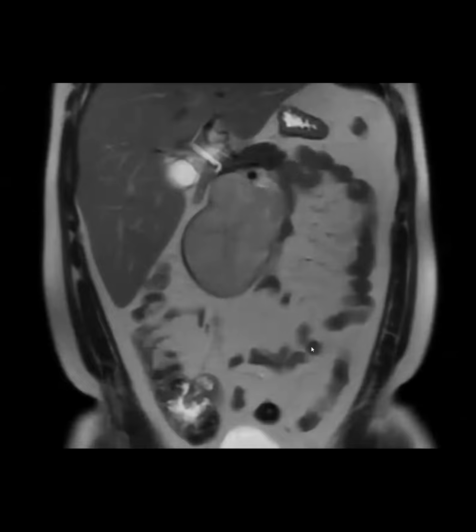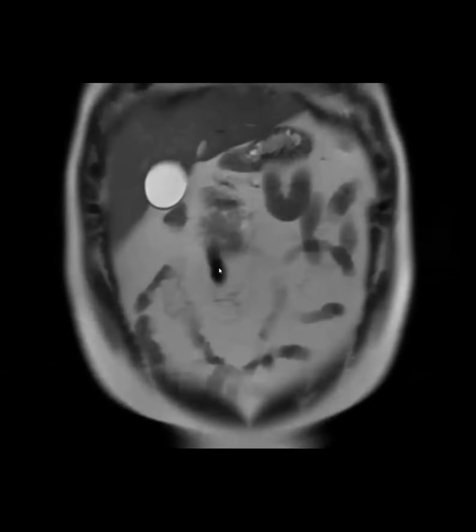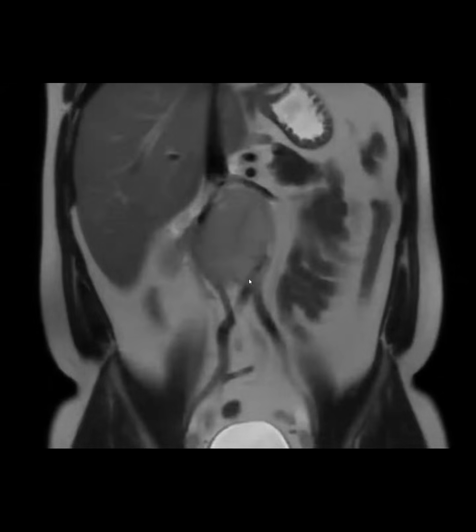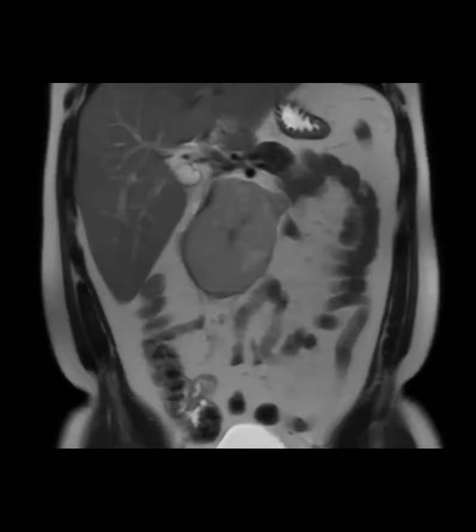Sorry, let me get these measurements off. Pancreas. Okay, I think there. So there is that intermediate thing that's affiliated with the pancreas, but the dominant thing is kind of not. It has an angular appearance on the left side. I don't know if that's anything. Yeah, like a bulge here. Okay. So I'm going to go to the next sequence.